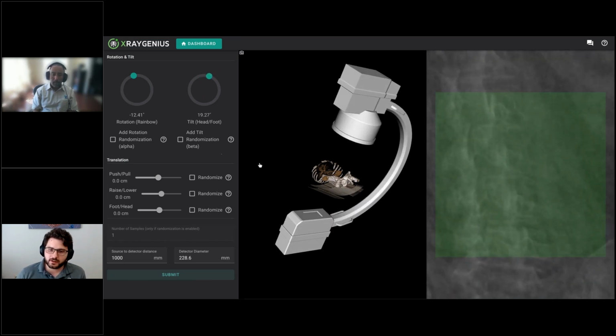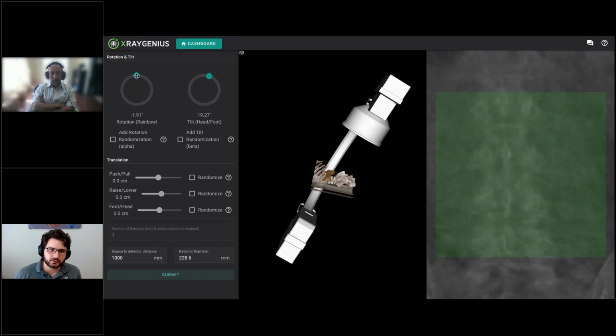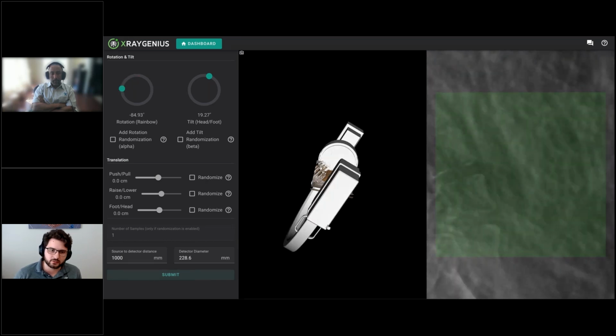So the first test case is a lateral intraoperative view that we're trying to mimic. We want a lateral view of the spine, for maybe some type of surgery, or we need to position a needle and we're trying to train an ML algorithm on that positioning. So we would want to rotate the view to the side to get that lateral view.